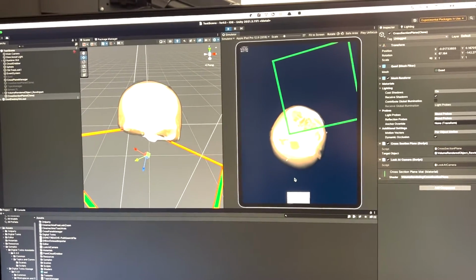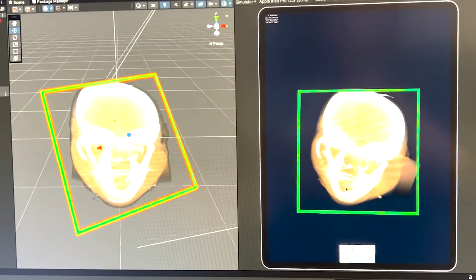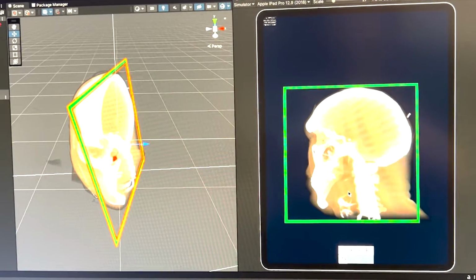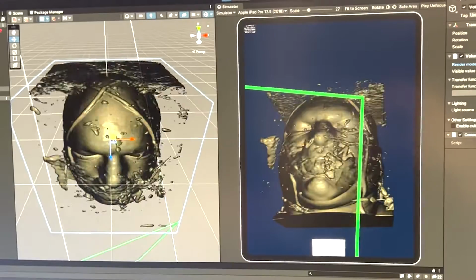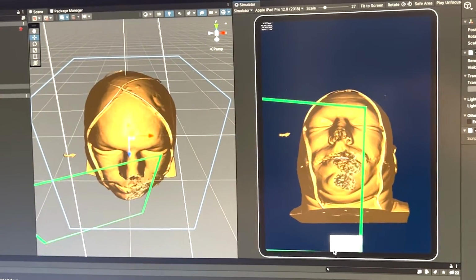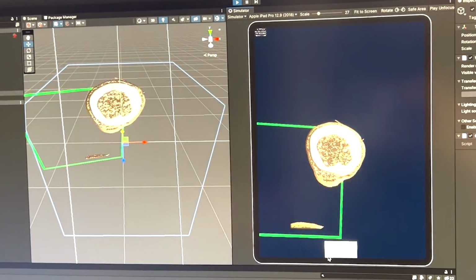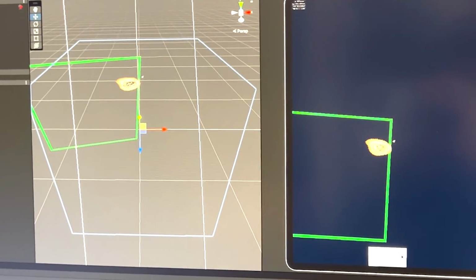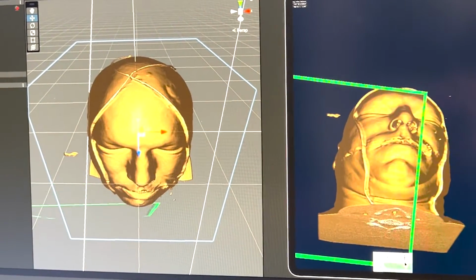We know that the MRI data is voxel-based and known as the DICOM file. We know that point cloud and voxel scan data are mathematically identical. We can treat an MRI and a CT scan as a point cloud. We also know that an STL does not retain voxel data. We also learned that the DTP does not support point clouds. We were not able to use the 3D streaming on the DTP.